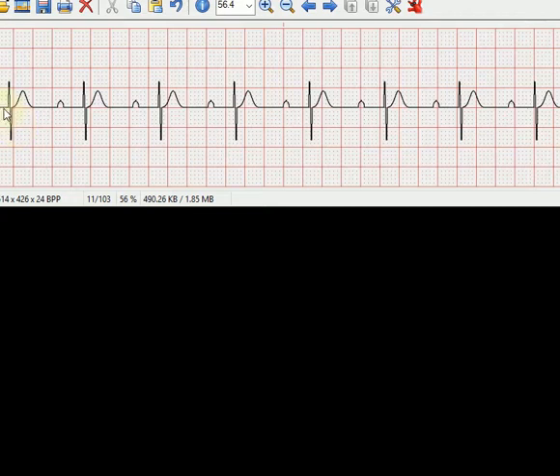This is a great example of what I was discussing before. You don't know if there's actually a P wave before that, so all the way through here, everything else matches out. So this is a 1 to 1 PR ratio on this, so that's the way to answer that question. How about PR interval?